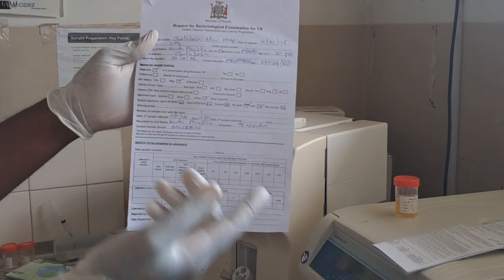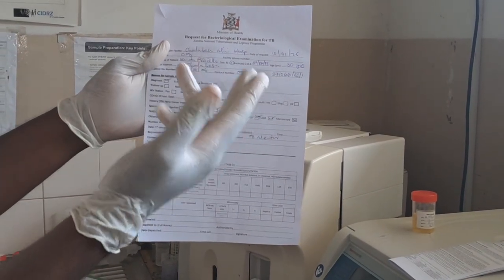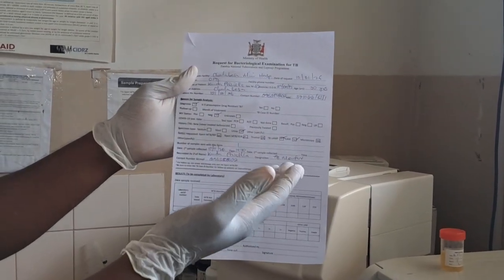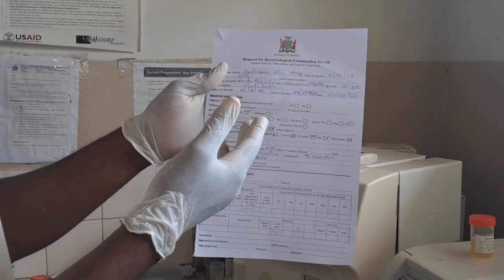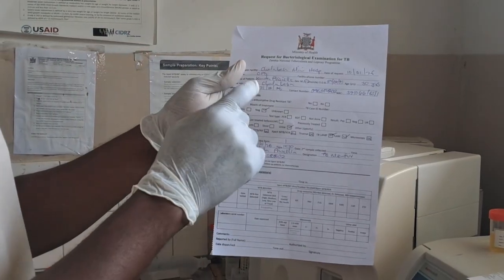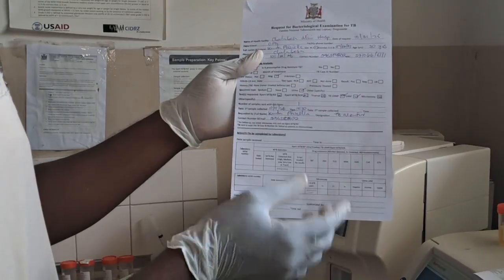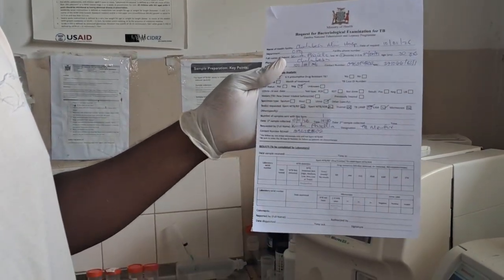What you're doing is making a diagnosis, it's not a follow-up, so you tick on diagnosis. If it's follow-up, you tick on follow-up. Patient's HIV status: if they come at the facility with unknown status, the facility does the test for HIV, then you make sure you tick. If the sample is collected in the community, we can understand. Then since we are doing urine, you tick on urine.